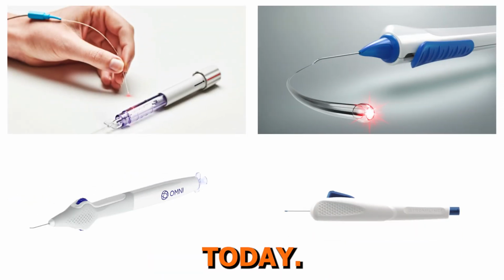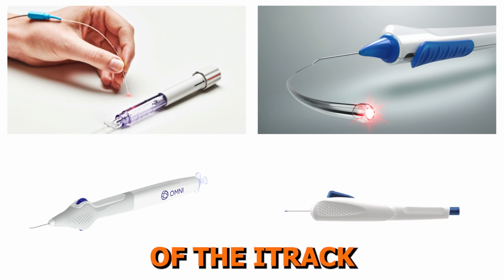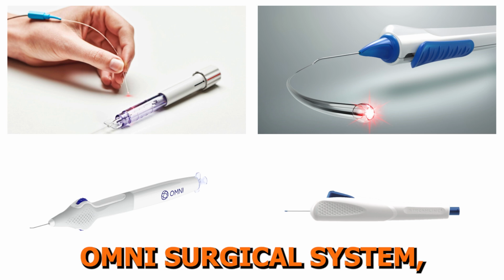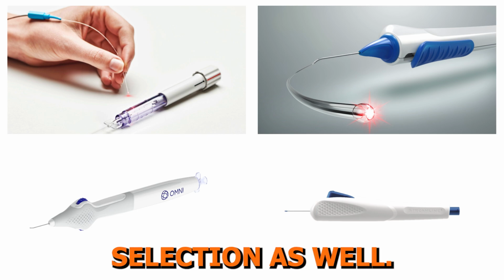So let's recap today. We reviewed canaloplasty techniques, angle anatomy, and the unique features of the iTrack, iTrack Advance, OMNI surgical system, and Streamline surgical system devices. We discussed some of the points to help with patient selection as well.